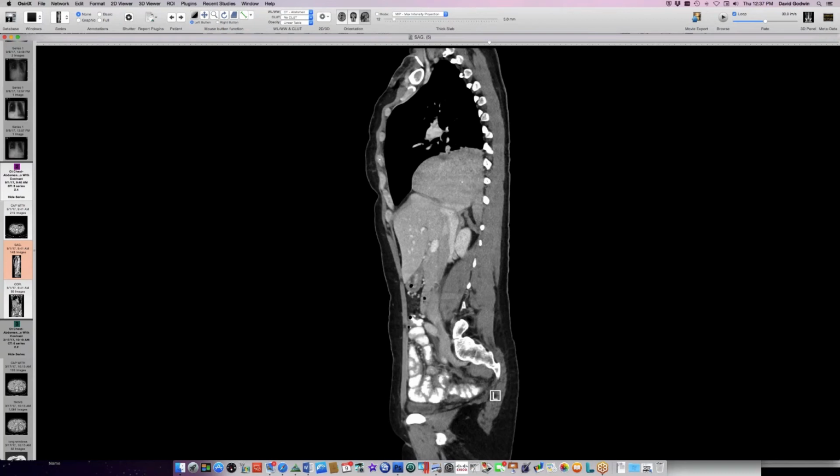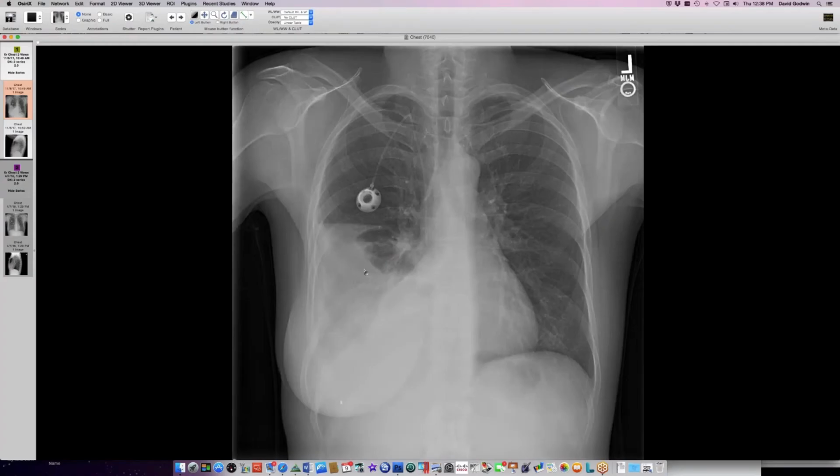And after that, this is post-op now. At this point, we have a big pleural effusion that's obscuring the diaphragm, so I don't really know what sort of contour the diaphragm has. We'll have to wait for a later post-operative imaging here to see if the diaphragm is looking more intact than before. So a complication here of treated hepatocellular carcinoma.